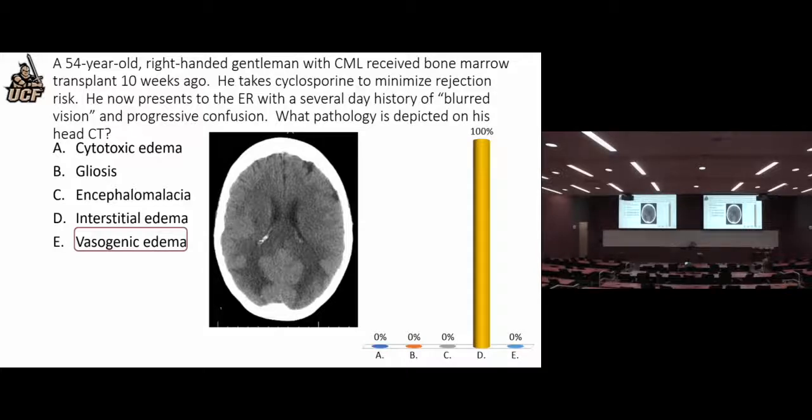And that was on Dr. Hussein's thing, I think. Well, see, here's the thing: cytotoxic edema would be like what you get in a stroke, and you would not have this differentiation of white matter around here, whereas you have it with the vasogenic edema. So I think we're going by the appearance of that.